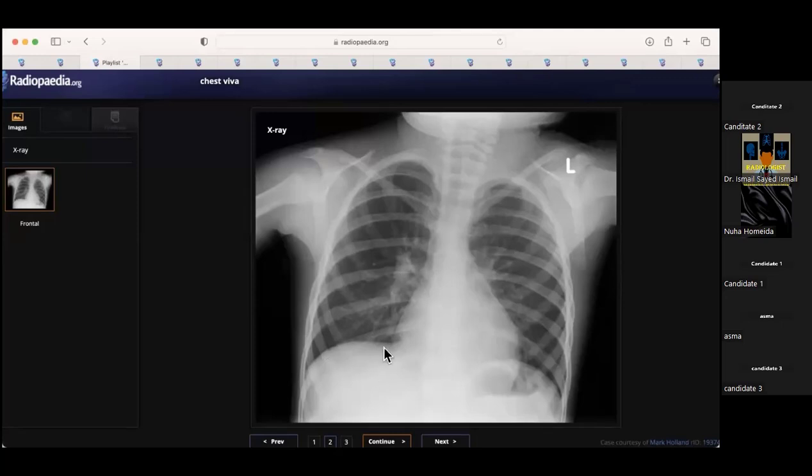So when you're presenting it, say, I can see that the right lung is hyperlucent, perhaps maybe not convincingly, but the splaying is quite evident here. So that indicates there is increased volume within the right side and no flattening of the hemidiaphragm. And as you said, you'd confirm that with something much simpler.